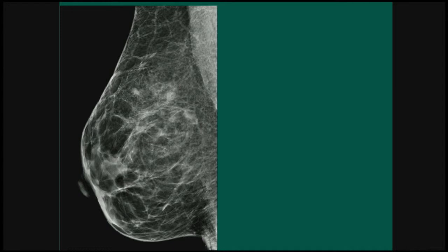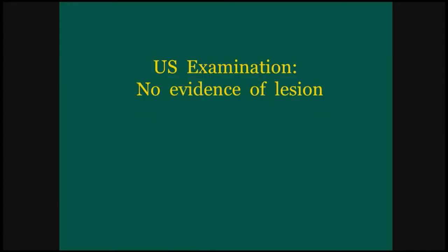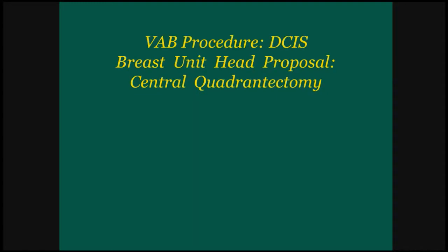This you can see here, a group of microcalcifications. It's better visualized here. And the follow-up examination by ultrasound showed no evidence of lesions. The lady received the VAB procedure. The diagnosis was DCIS. The breast unit proposed a central quadrantectomy without any other imaging.